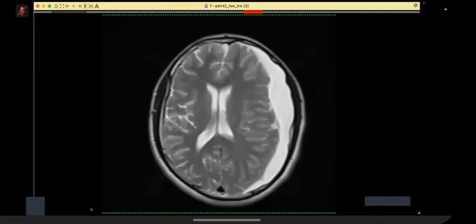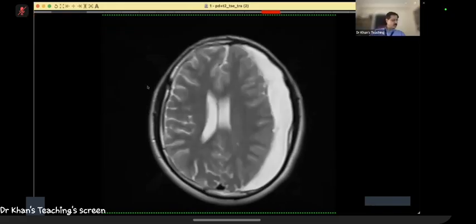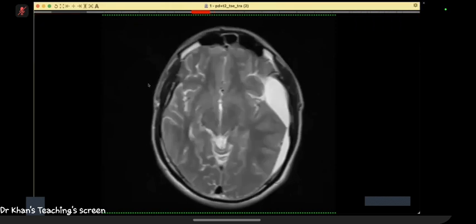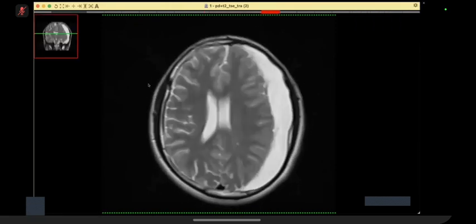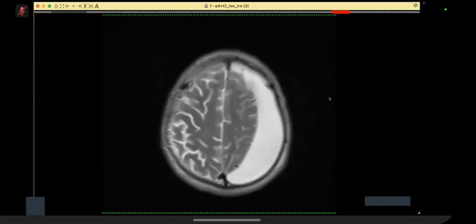Okay, candidate 3, are you with us? Yes, sir, can you hear me? Okay, so this is an MR of a 16-year-old. The patient has presented with headache. Over to you. Out of control, please. You can scroll, I don't mind.